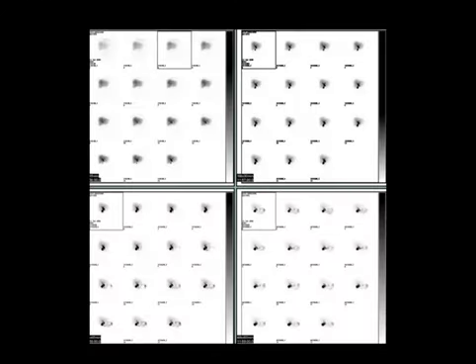So at the end of an hour, we should see prompt uptake and excretion of the radiopharmaceutical from the liver into the biliary tract. We should see activity transiting from the cystic duct into the gallbladder, and the activity should go also from CBD into the small bowel. So those are some of the components of a normal HIDA scan.